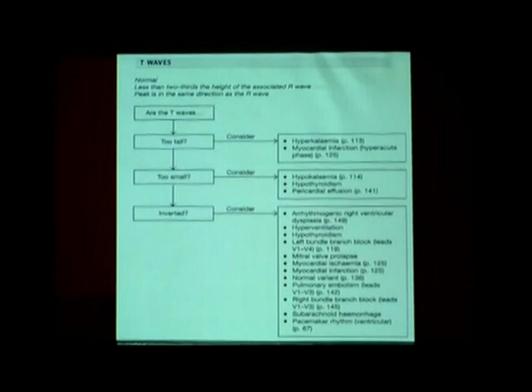Whereas when the T wave is of low amplitude, it could be a hypokalemia or a non-specific STT change. So this is as far as the upright T wave is concerned. When the T wave is inverted, once again 2 different diagnoses: secondary STT change or a primary STT change.